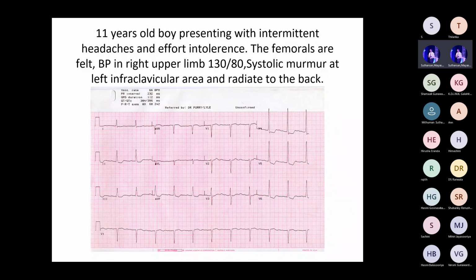Okay. Now, what is the abnormality in this ECG? This you should know. If you go by rate, rhythm, axis, PR interval, and then after the PR interval, you assess the QRS complexes. In the QRS complexes, you assess the S wave, R wave, Q waves. So what's this? Because there is deep S in V1, tall R in V5, V6. The summation is more than about 35, right?